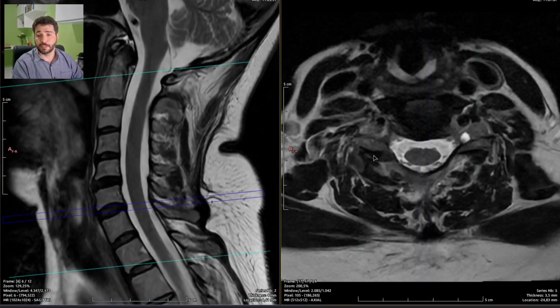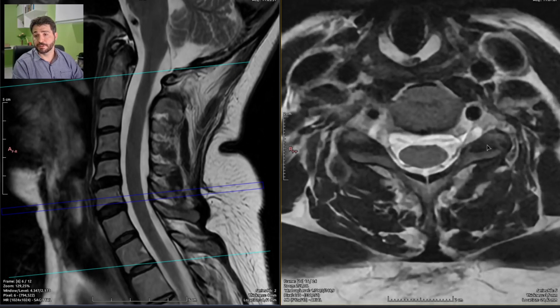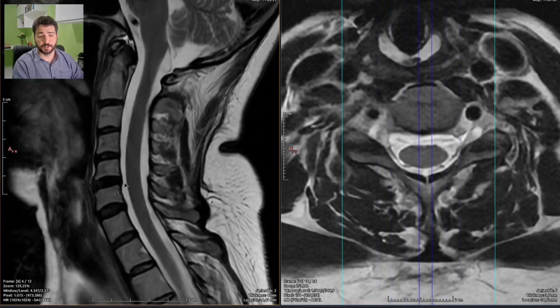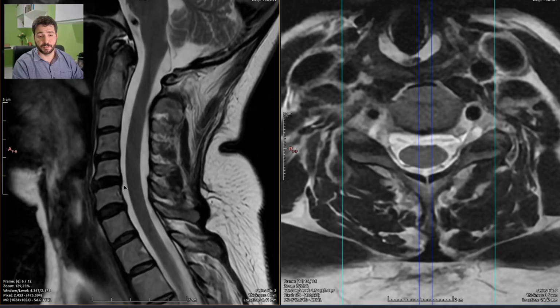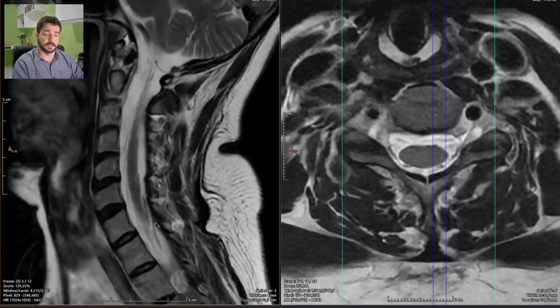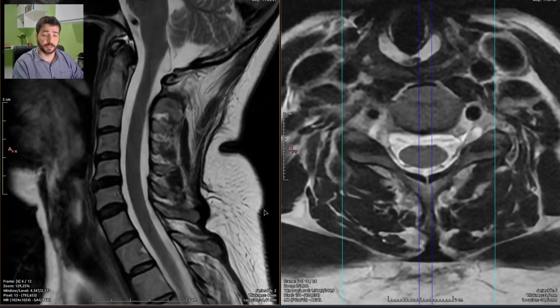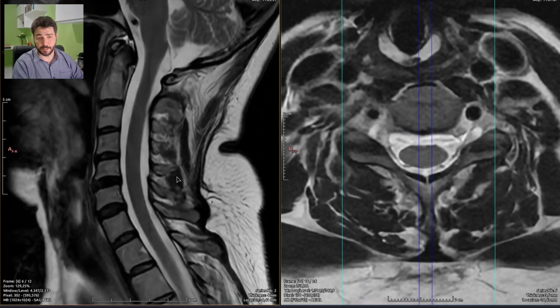It shouldn't be related to pain. So we can also say that there are mild degenerative signs on the facet joints and on the uncovertebral joints, especially on the segments where there are also bulging discs. So this is the complete picture of a mild chronic painful cervical spine. That is degenerative disease of everything and some mild bulging discs. So let's go for the report.